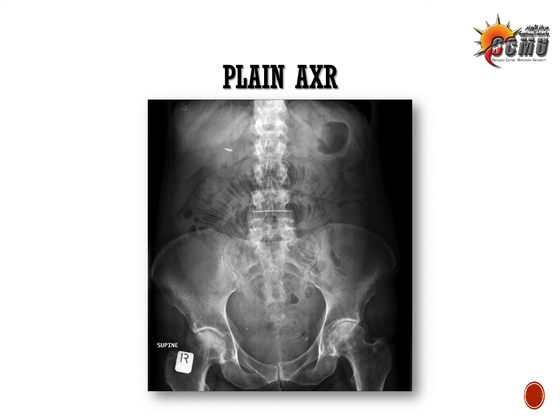So let's take this film. It's for a 70-year-old lady who presents to the emergency department with abdominal pain and distension, and she actually reports a history of bowel cancer. If you examine the film, you will see that in the center and the periphery around the vertebrae, there is a stretch sign which denotes fluid-filled small bowel trapping air on one side of the valvulae conniventes, and this denotes dilatation of the small bowel with distal obstruction to this small bowel.